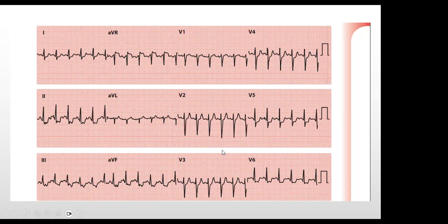So for a patient to have widespread depression tells me that there may be some form of hypoperfusion for whatever reason. And if the heart is fast, as it is, this is about 150 thereabouts, looks regular, then the diastolic function will be affected because the heart is not resting enough for diastole to happen, which does perfuse the heart.